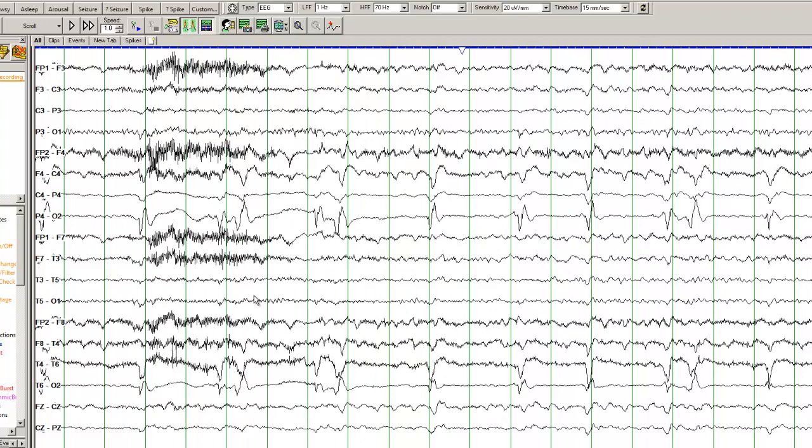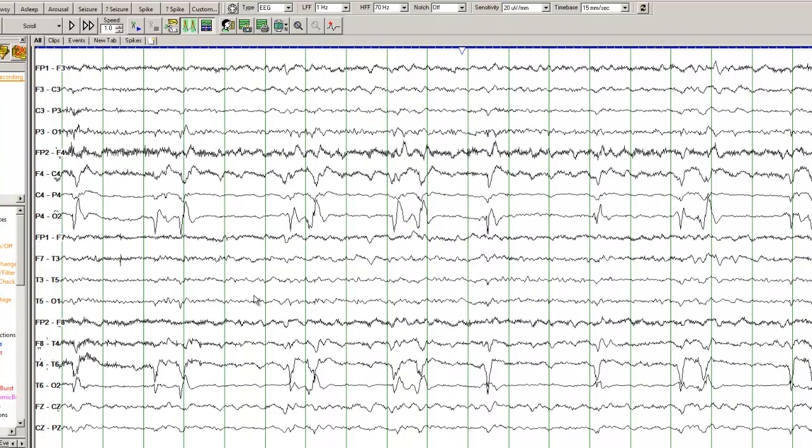So rarely you can see the epileptiform discharges in both hemispheres. Many times you just see it lateralized to the one hemisphere. If you recall the MRI that I just showed you, you can see that these correspond to the lesion on the MRI.